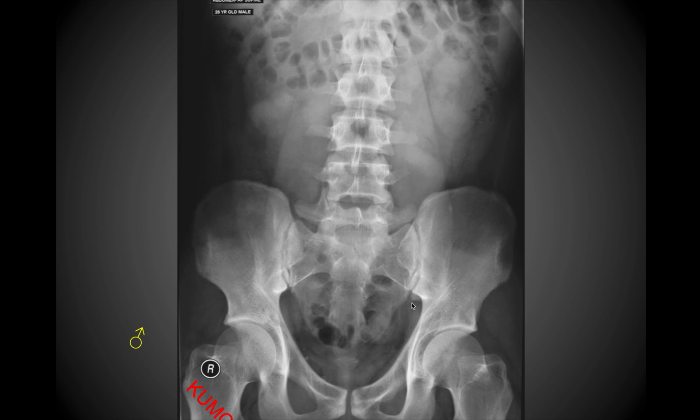And so when we look at the pelvis in this individual, you'll notice that it is rather narrow compared to what you'd expect with a female. So that makes this a male individual. The female pelvis should be more circular and wider than this. The ilium, or iliac bones, you'll also notice, are quite vertically oriented as opposed to flared out in a more horizontal position like you expect to see in females. You can clearly make out the femoral heads right here sitting in the acetabulum. And then the subpubic angle, you'll notice on this individual, is also relatively narrow, which also suggests that this is a male.